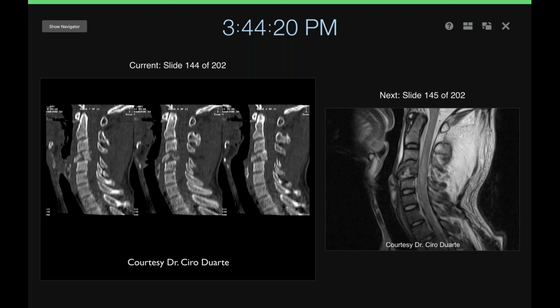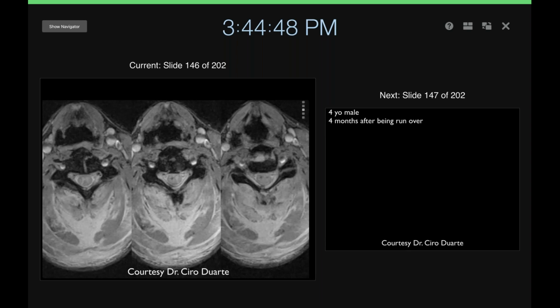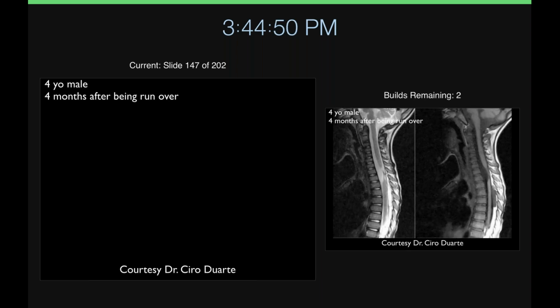The soft tissues posteriorly are really swollen and there's probably hemorrhage there, and certainly a lot back here. It's relatively subtle anteriorly, but that's abnormal as well. Here's the MR scan. So, big hemorrhage and edema in the soft tissues posteriorly. Obviously this is a very unstable fracture involving the anterior, middle, and posterior columns, and then you've got the contusion and probably some hemorrhage into the cord.